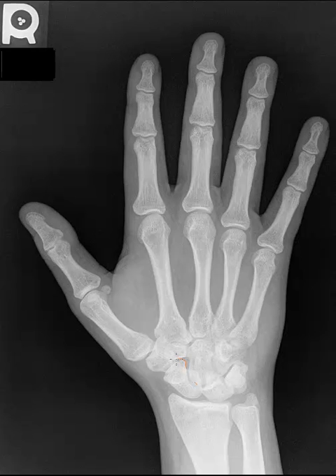Here is the scaphoid. Now, the scaphoid is a very important bone and should be paid close attention to because this is the most common carpal to fracture. Typically, the fractures in this location will occur by what we call FOOSH injuries, also known as falling on an outstretched hand. So any type of activities in which a person may fall and want to break their fall using their hand, this particular bone is very susceptible to fracture in those types of mechanisms of injury.